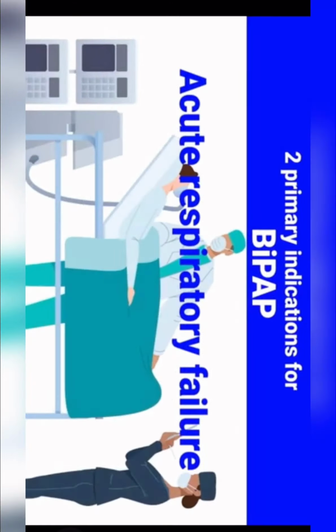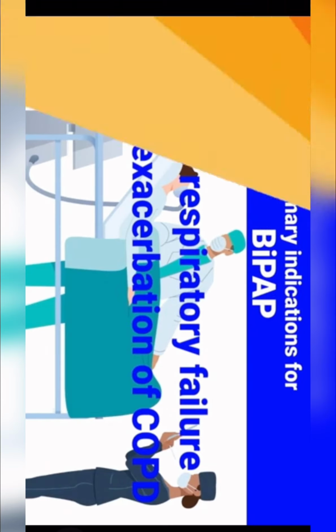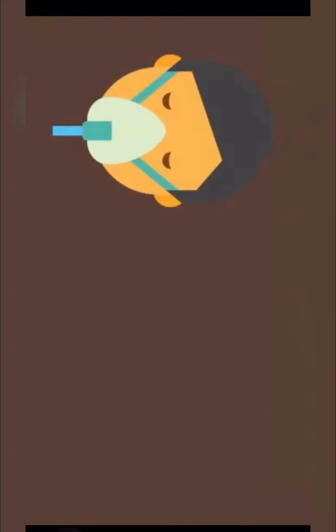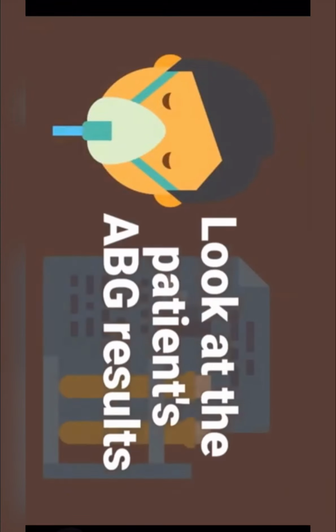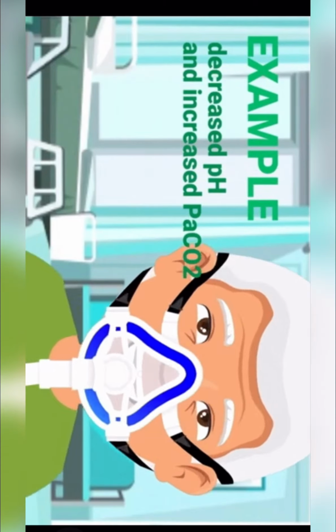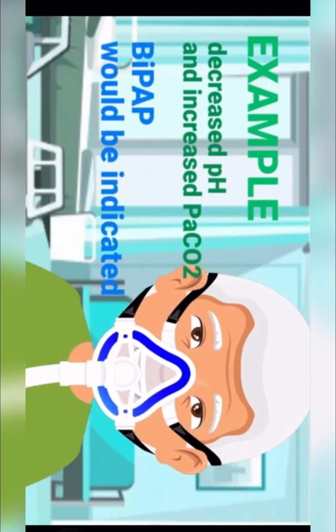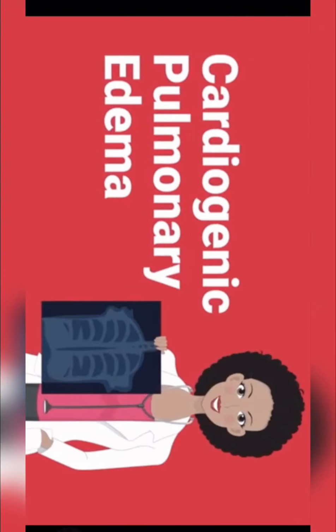There are two primary indications for the BiPAP: acute respiratory failure and acute exacerbation of COPD. The best way to determine if BiPAP is indicated is to look at the patient's ABG results. Just to give an example, the patient has a decrease in the pH and an increase in PaCO2. We could recognize the ventilatory issue present, and BiPAP would be indicated.